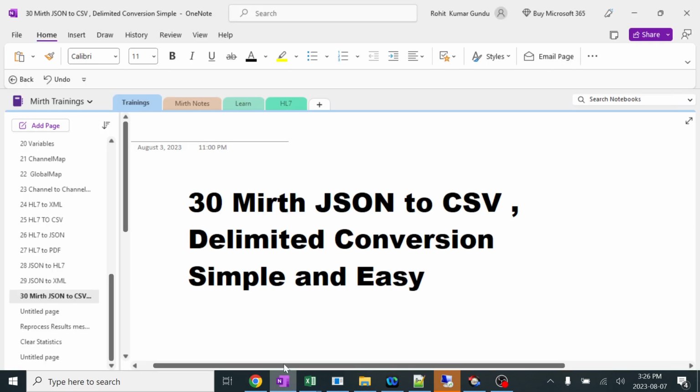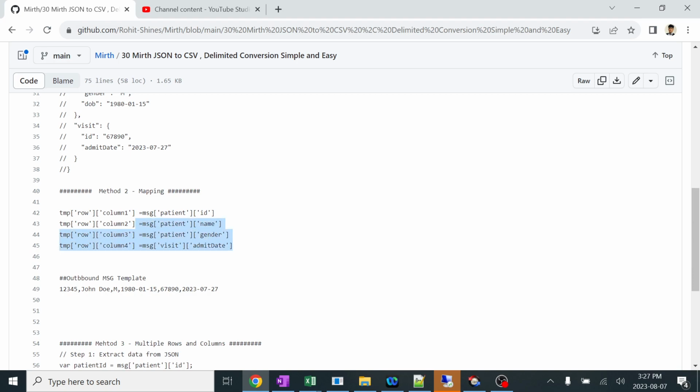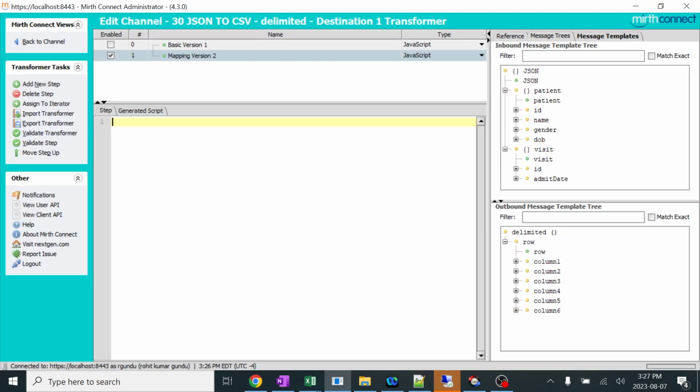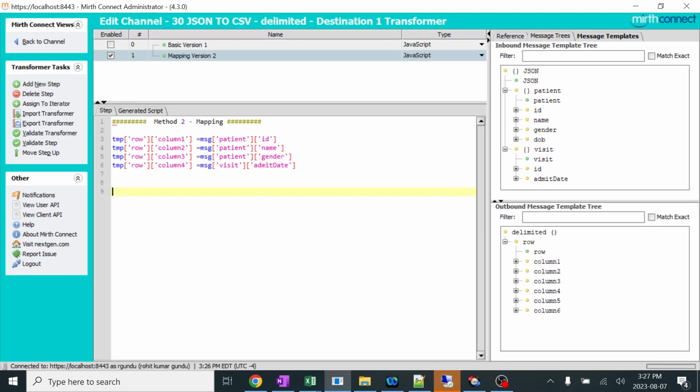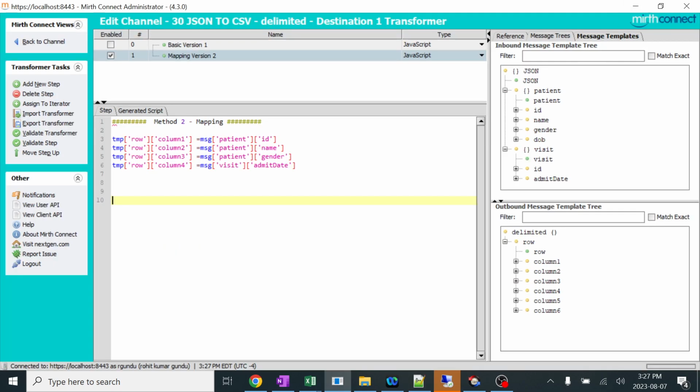As I already did this coding, drag and drop thing over here, I'll just copy it, okay, and I'll paste it. You might be asking, what are you doing? I'll give an example. I want to map these particular details to these particular details. I'll drag column 1 like this. Column 1 you can see over here, and I'll keep equal, and in the column 1 I need patient ID. I'll go here, I'll drag the patient ID.